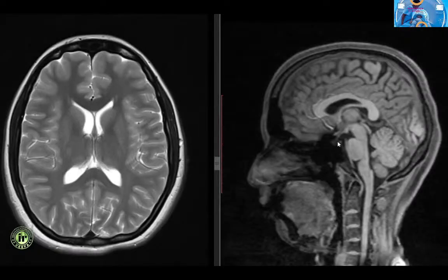Let us have a look at the cerebral ventricles. In young adults, the ventricular system normally contains 20 to 25 ml of cerebrospinal fluid. The lateral ventricles are C-shaped cavities with corpus callosum as their roof. Each lateral ventricle has a frontal horn or the anterior horn which projects into the frontal lobes anterior to the interventricular foramen of Monro and body which is posterior to the interventricular foramen.